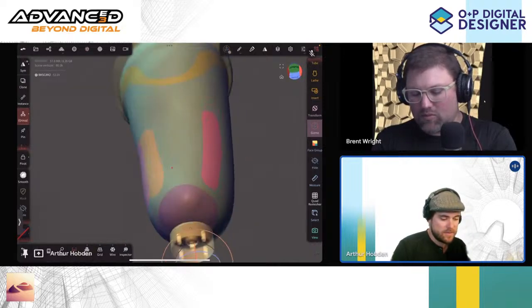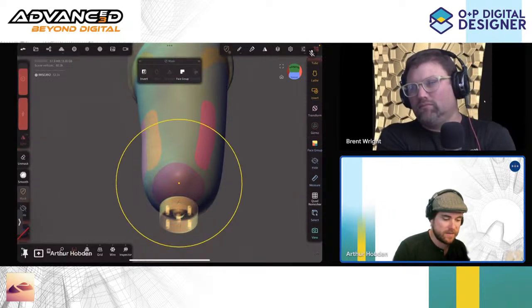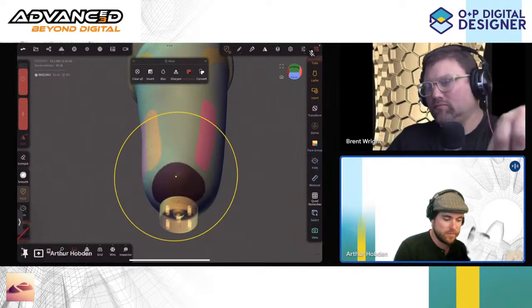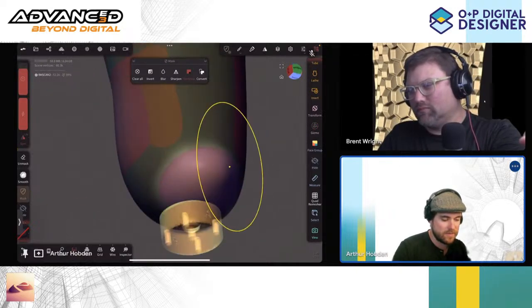And all right, so first one, let's do the distal tip. If I mask, I have to mask to a group. Can I turn on face groups? There we go. I'm just going to blur that so we get a nice blurred line. We can invert that mask, and now we have that to modify.